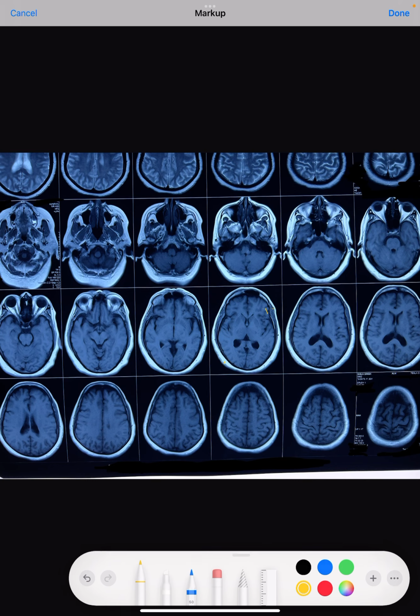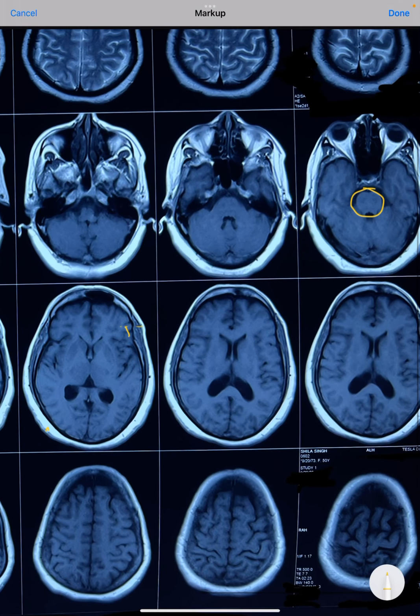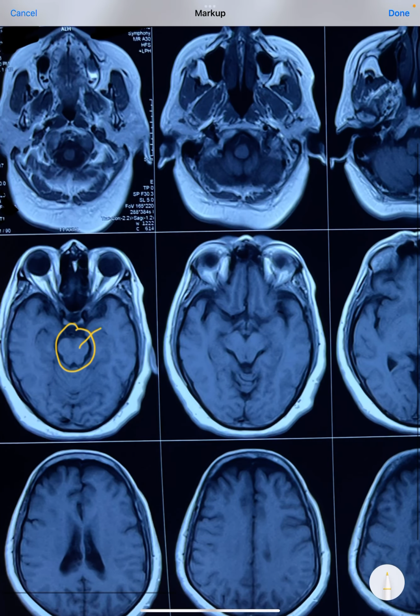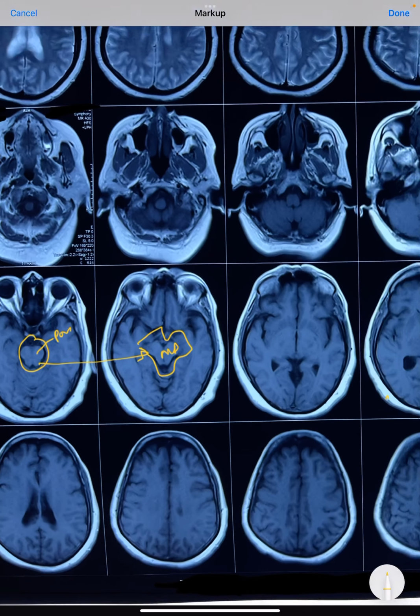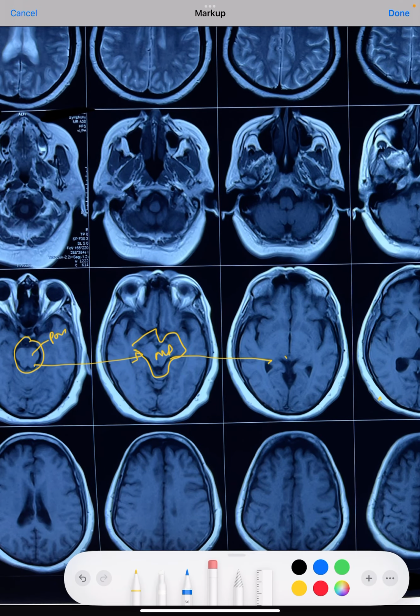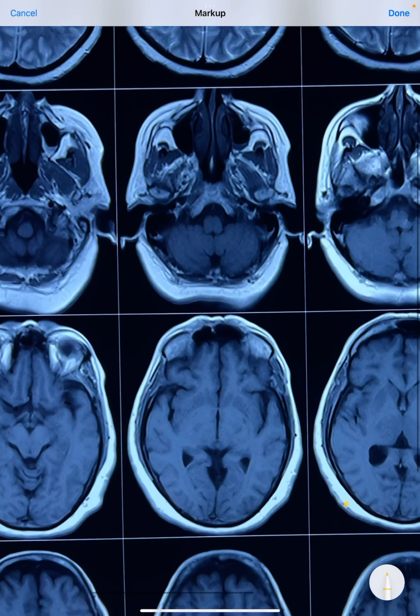How to identify it is very easy. The circular most portion is the pons. The lower portion is also pons, and above it, this is also pons, almost the circular portion. The butterfly-shaped structure is then the midbrain. So this is transforming into the midbrain, which we can see here. Just posterior to this brainstem is the cerebellum. So this is all cerebellum, just posterior to this.